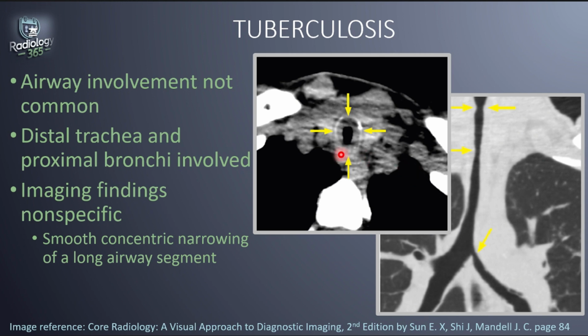So these images are cases of tracheal tuberculosis, and in this axial CT, the soft tissue window, we see circumferential tracheal thickening. The coronal curved multiplanar formation shows multifocal tracheal stenosis. Follow the arrows, and left mainstem bronchus stenosis here. These images were obtained approximately 1 month after treatment for active post-primary TB. So you can just see these areas of stenosis, and like I said, it's quite non-specific, so you will be guided by the history that you would be provided.